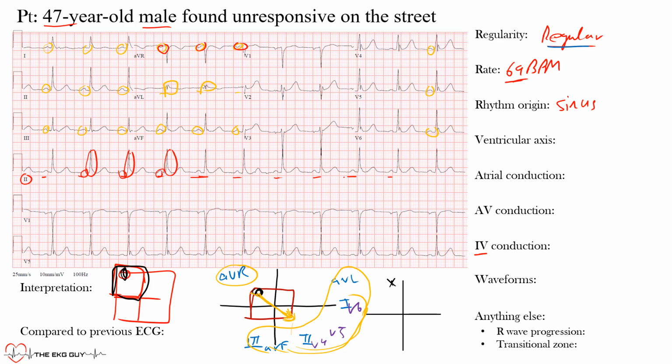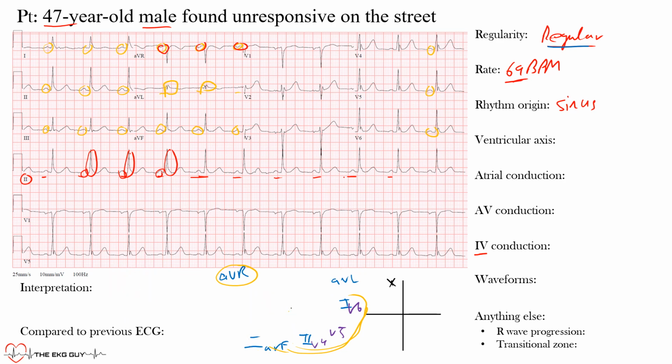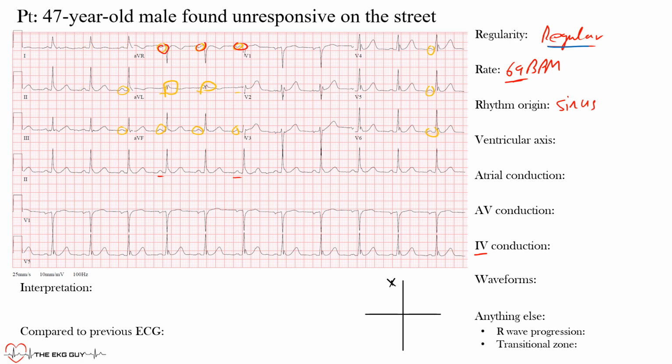Now let's find the ventricular axis. This is an area of a lot of confusion, but hopefully we have an easier one here, and hopefully this will help reinforce some of those concepts. It's really not that difficult, but I certainly see where the confusion comes from, and I remember that was an area of struggle for me when learning. So you are not alone.